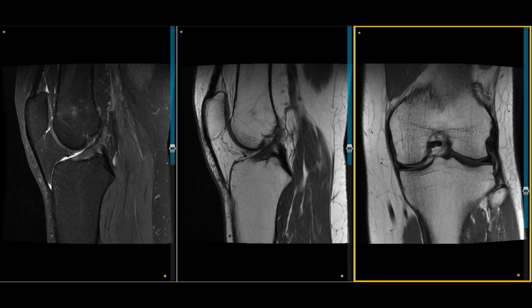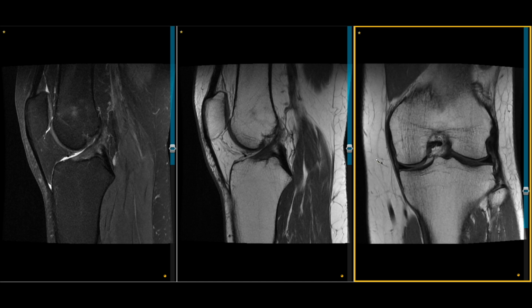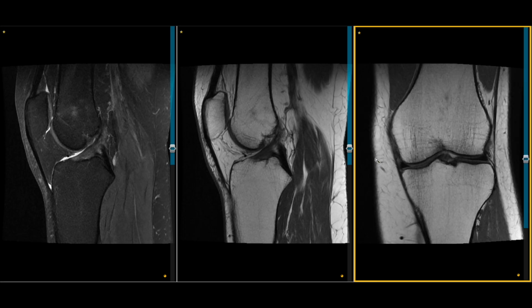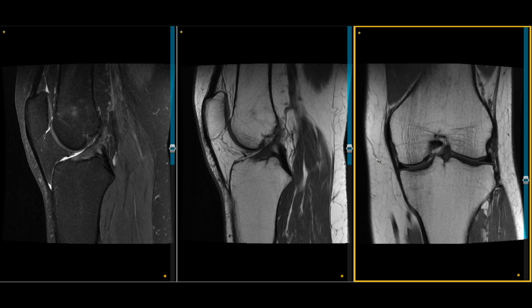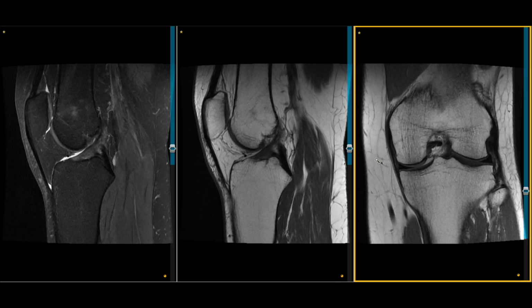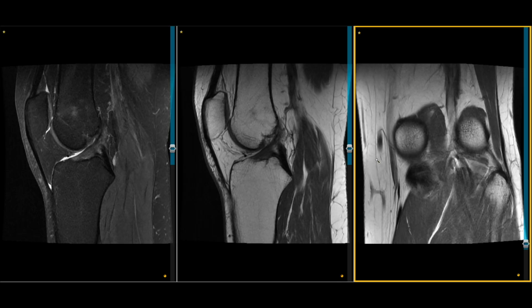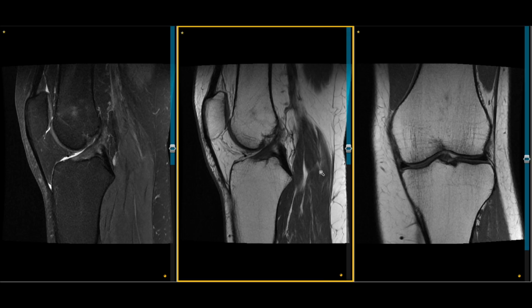So I'm going to go through a case of a normal thickness elongated ACL heal. This is a patient that's at 12 months post CBP. Looking at the coronal images, you get a nice feel for the ACL contiguity from its tibial footprint to the femoral footprint. You can see as I scroll through these images that the ACL looks fairly uniform in not only its signal but also its thickness all the way through, and that the ACL is contiguous.